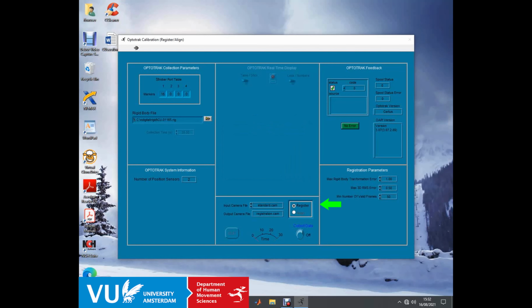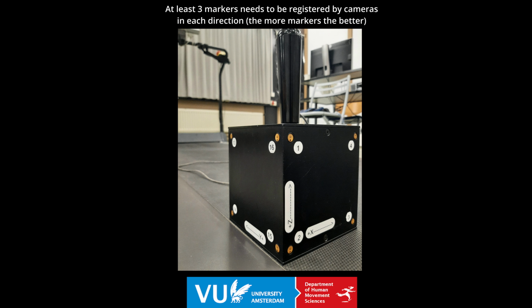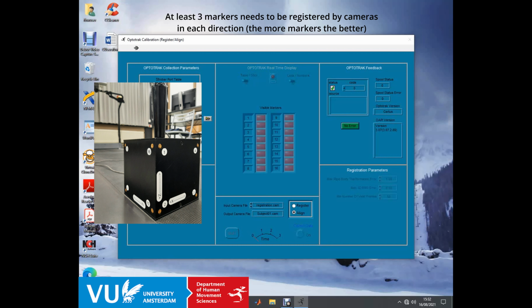Press OK and wait until the black dot goes from register to align. Here we need to define the alignment for the Optotrak system. As you can see in the picture, we define the x-axis in the mediolateral, the y-axis in the anterior-posterior, and the z-axis in the vertical direction. Here, make sure that the cubes are registered by all cameras and then press the Collect Data button.